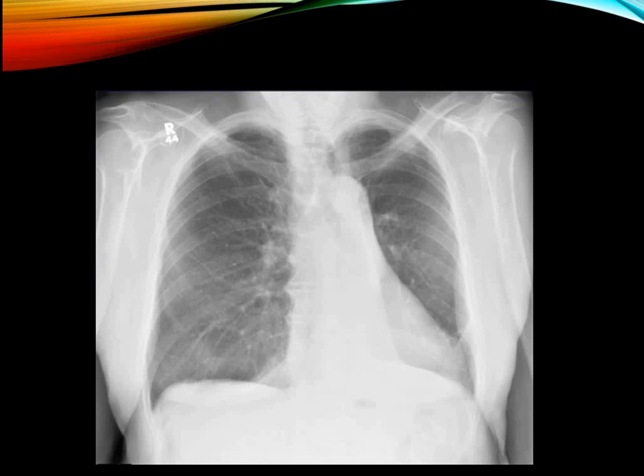If we put these points together, we see shifting of the mediastinum to the left and elevation of the left dome of the diaphragm, which are signs of loss of volume, plus retrocardiac triangular opacity or left double cardiac borders. Together they give one conclusion: left lower lobe collapse.